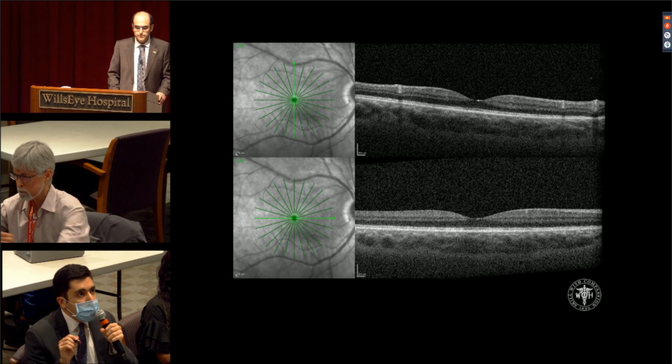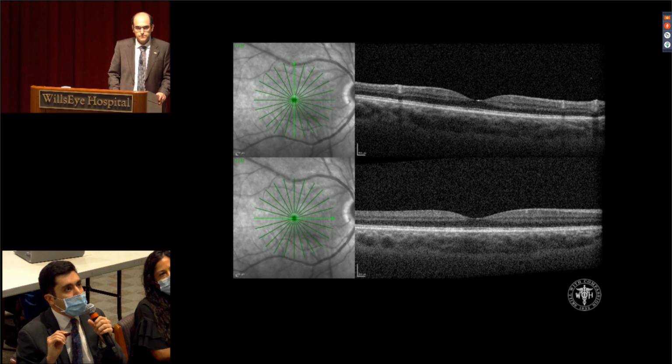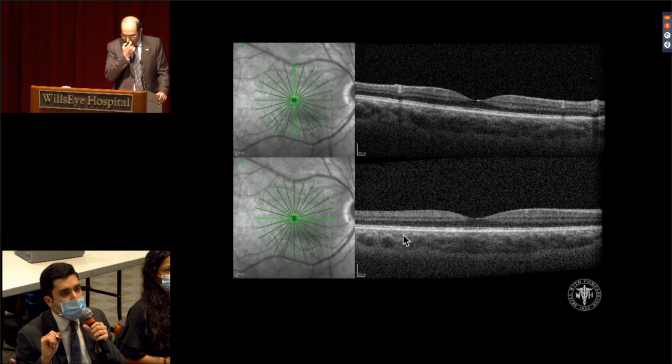So we have a horizontal and vertical OCT going through the right fovea. The infrared image appears grossly normal, and looking at the B scans themselves, maybe one cell that we can note here. The choroid appears to have a normal, maybe slightly increased, but not too bad thickness. The architecture appears grossly normal here, and looking at the retinal laminations, the inner retina appears intact, and looking at the outer retina, the RPE looks okay, maybe a hint of some ellipsoid zone loss here in the temporal aspect. Not too bad.